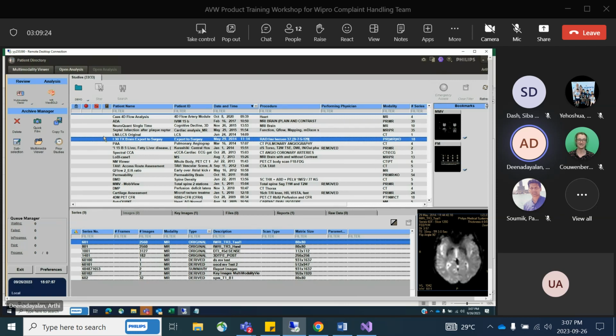In MR, there is one more trick to identify the series. Usually MR studies will be huge, and the particular functional series will also have a huge number of images. For example, if you take these two, the fMRI hand and fMRI TAL series, there are 2560 images. So this also indicates these are functional series which can be loaded into a functional application. Okay. Now I'll go to another application called diffusion.